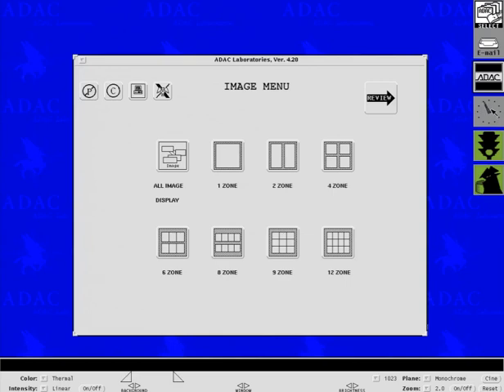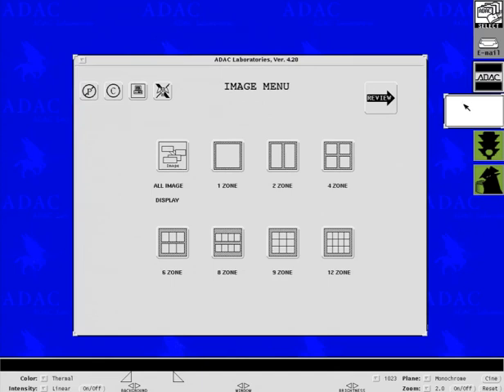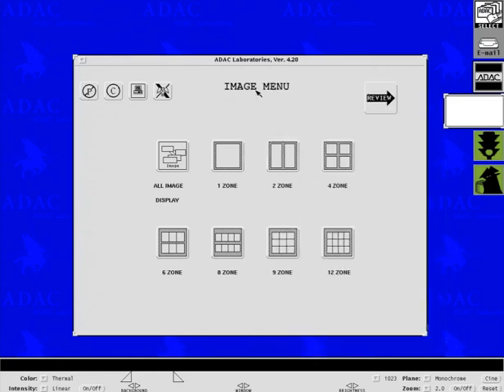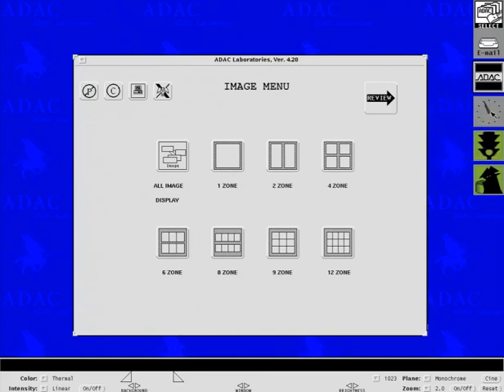Here we have our clock. It can be represented in analog time or in digital time. If you open it, depending on how you open it, it can show you. Let's go to properties. I'm going to say analog. Well, actually, I'm going to say digital. Let's grab this. Oh, how come I'm not seeing anything? Close. Anyway, regardless, I'd always leave it as analog. There is a way to switch it to digital. I just am not thinking right now very clearly.